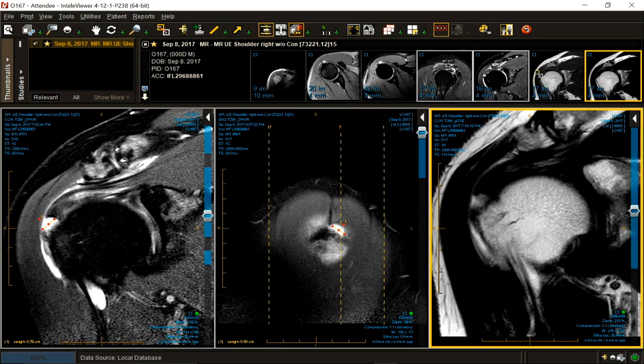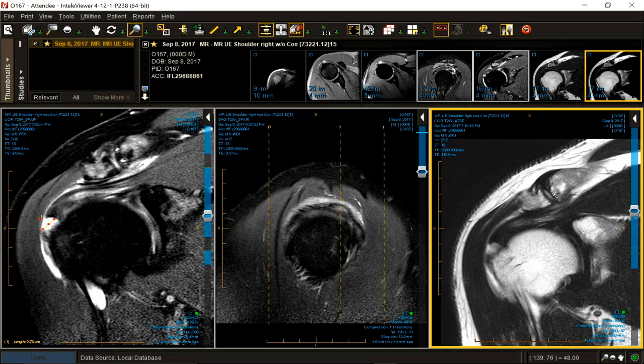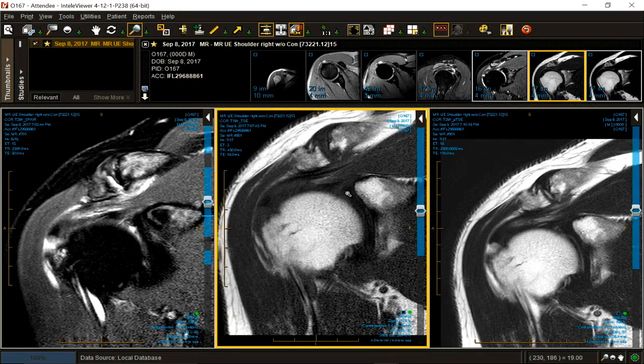What am I going to do with the acromioclavicular joint? It's a man. He's middle-aged. He didn't describe pain on top. It's not very impressive on the T2 weighted image. Everybody's AC joint is bright on high-quality fat suppression imaging. It's arthritic. It's going in the body of the report: moderate, hypertrophic osteoarthritis of the AC joint without active inflammation or with scant inflammation. It's not going in the conclusion. I don't want to draw anybody's attention to it.